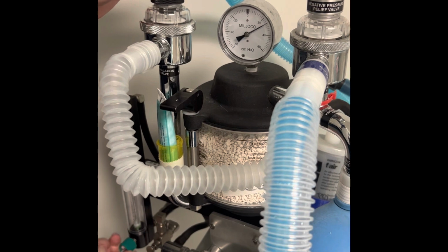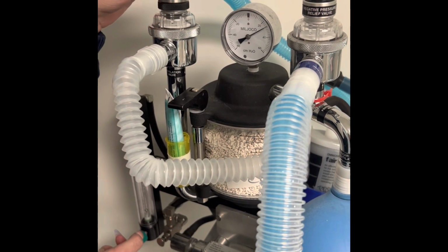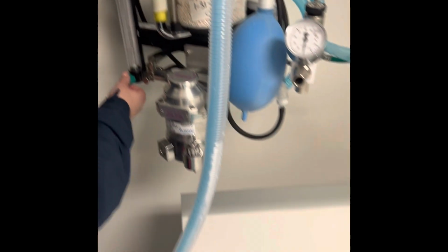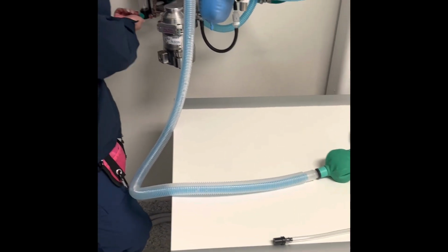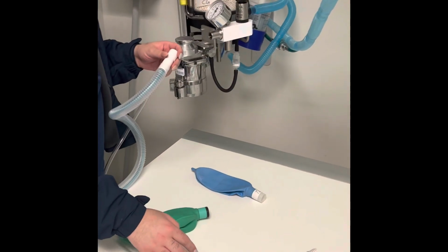And to do that, I crank my flow meter down to about 0.2 liters of oxygen per minute, so about 200 mils. And it holds pressure, so my machine leak tested well.